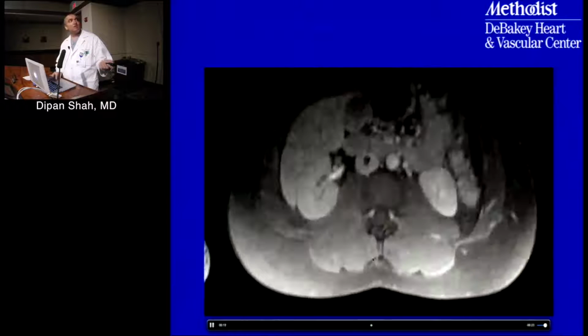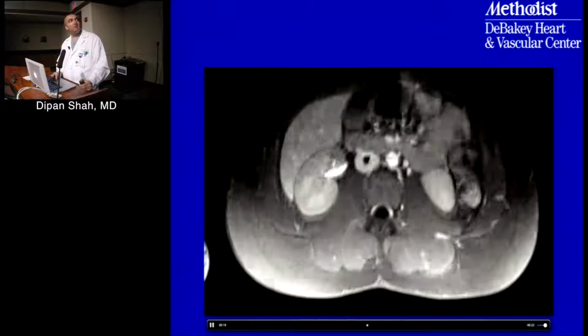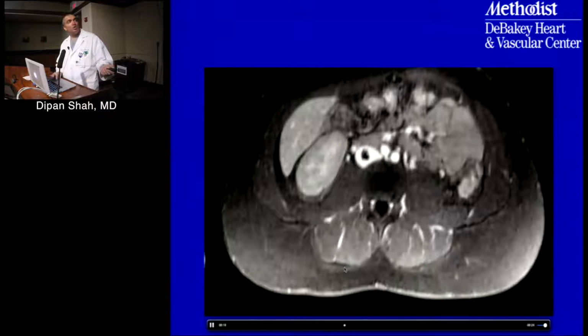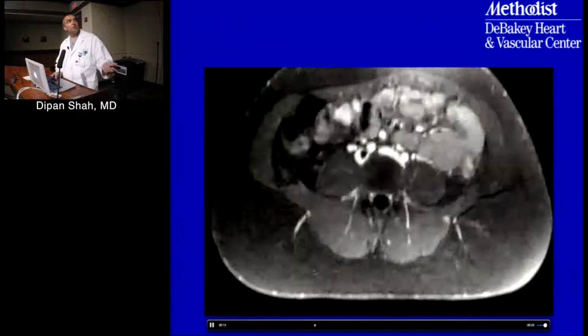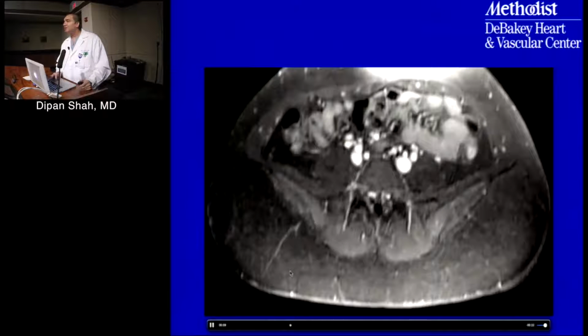And also, would a catheter look like this? If you look at the size of this, most of the catheters tend to be much smaller. They tend to be much more circumferential, right? Whereas this is not quite smooth and circumferential. So absolutely, that's one of the things you have to think about. The other thing is, if it is a catheter, you would expect that it should go all the way out, probably to the femoral, because typically the insertion point is going to be the femoral veins. Whereas this thing stops abruptly. So I think catheter is less likely.